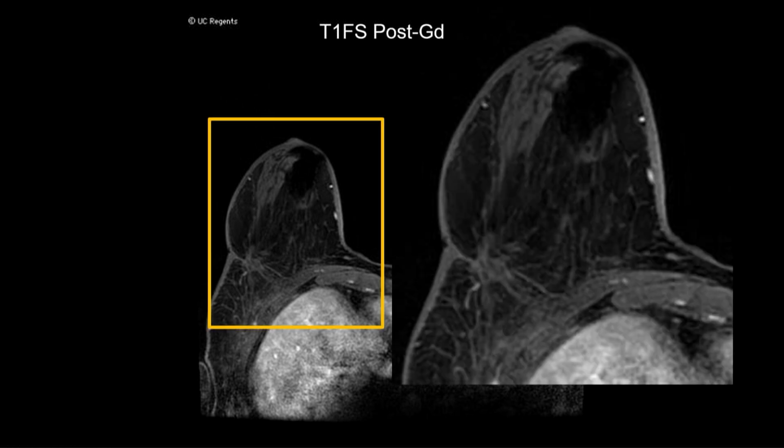And then you look more closely and you see that, boy, it's really black there behind the nipple. Okay, so what is this stuff? This is just a photographic enlargement, so I just zoomed up the image so it would display. Okay, anybody know what this is? Or anyone use this at your institution? It's really, really black. It's actually a type of susceptibility.